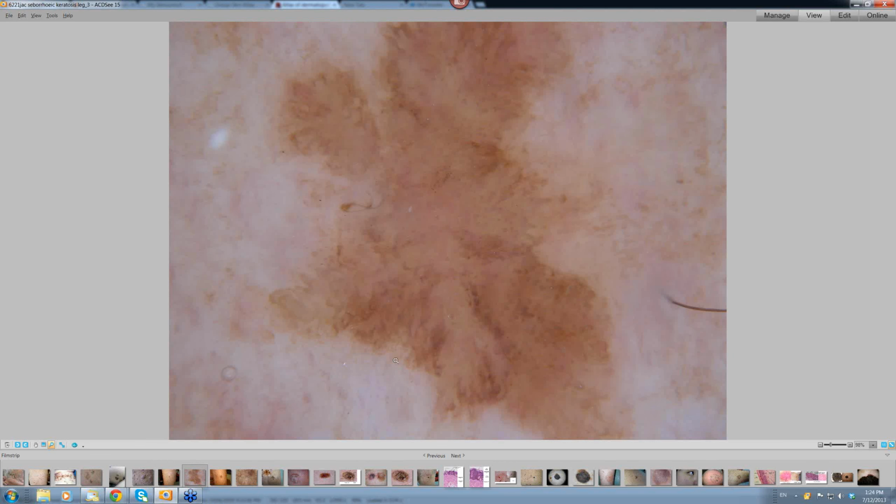This was the dermatoscopy of that particular case. There isn't really any sign of a pigment network there. You can get pigment networks in seborrhoeic keratoses, but there isn't in this particular specimen here. You're also looking for little milium cysts, and we'll see these in the dermatoscopy of some other lesions.